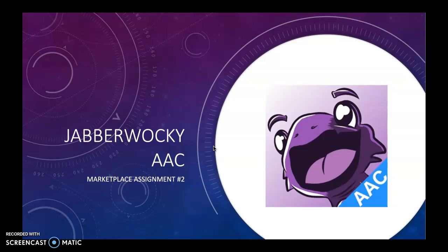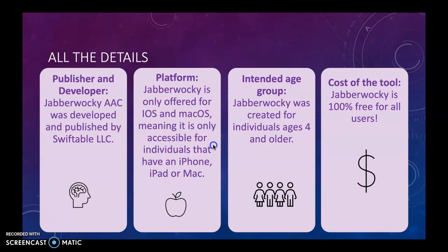For this assignment, I'm going to be teaching you about and demonstrating Jabberwocky AAC. Here are all of the details. The publisher and developer. Jabberwocky AAC was developed and published by Swiftable LLC. The platform. Jabberwocky is only offered for iOS and macOS, meaning it is only available for individuals that have an iPhone, iPad, or a Mac.